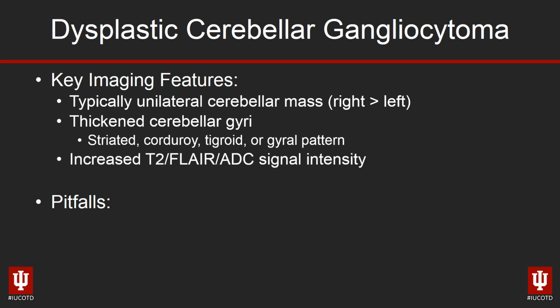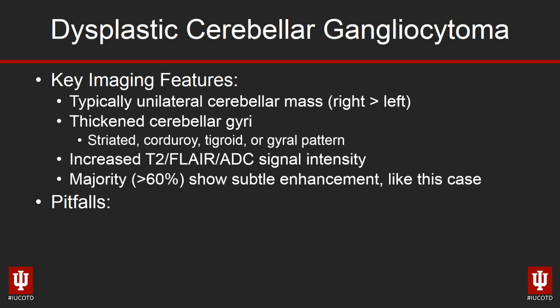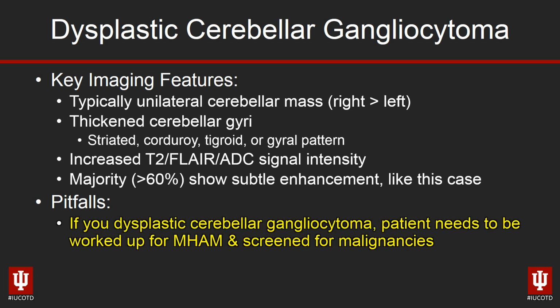And again, bright on T2, bright on FLAIR. The paper from Mayo showed nicely that these tend to be bright on ADC as well. And in their series, they found that more than 60% of the time they showed subtle contrast enhancement, just like in this case. A couple pitfalls.